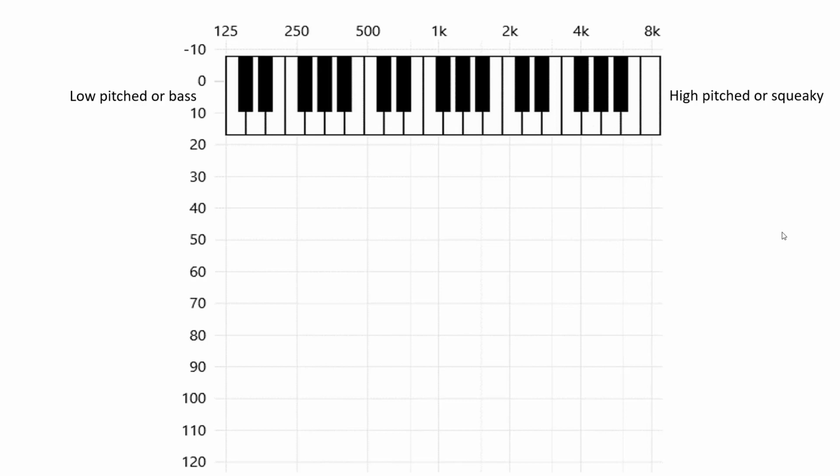Just to give you an idea of the kinds of sounds you're thinking about there, for a high-pitched sound, you can imagine the sharpness in a syllable like s, s, an S sound. And for a low-pitched sound, you might think of a vowel sound having peaks in energy around 250 to 500 hertz. Ooh, ooh, ah, ah. Those are relatively low-pitched sounds. So that describes the two axes of the audiogram.